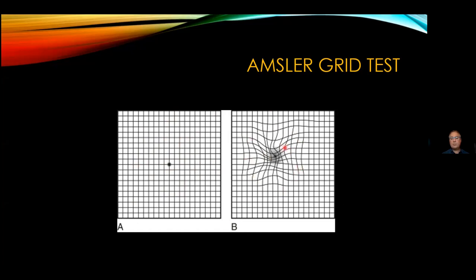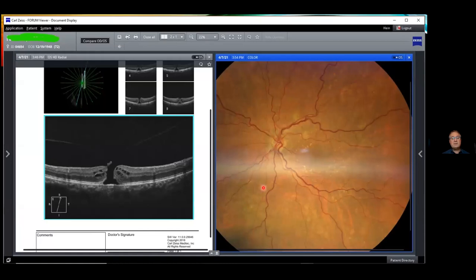This is an abnormal Amsler grid test. So for the patient that had the stage 2 macular hole, one would give an Amsler grid, say do a weekly test. If you think there's a change, let me know, and from my practice, we do 6 weekly OCTs.